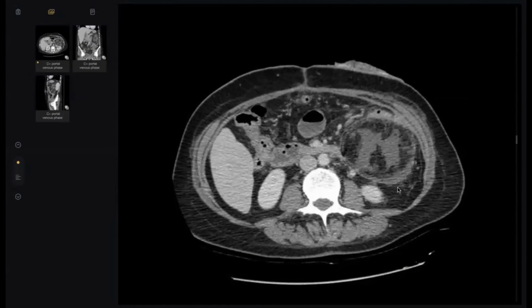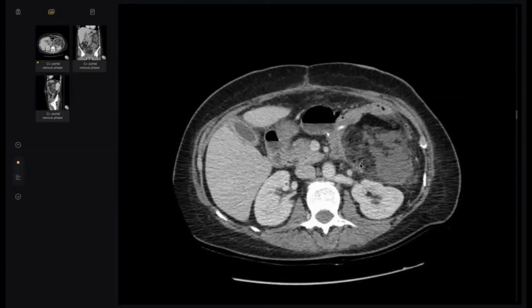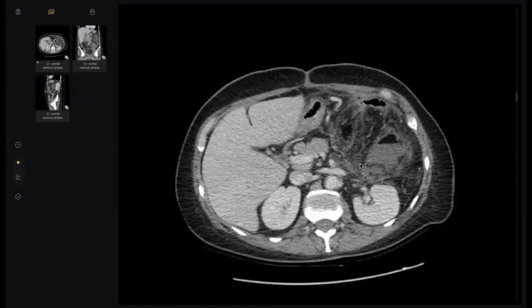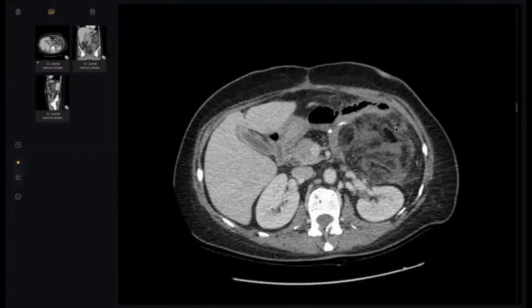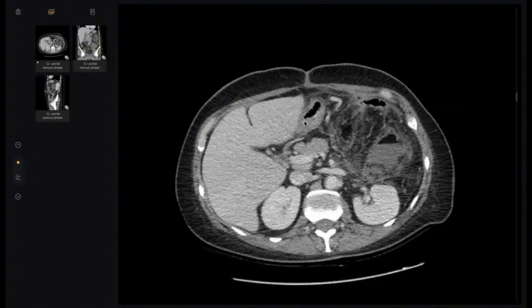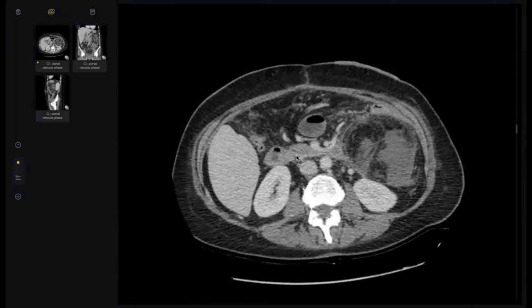But here we find abnormal fat, and the patient is post-operative, so we must put number one, omental infarction, in the first differential diagnosis. Number two, leakage. Why? Because there are anastomoses here, a loop and a loop. Look here, this is the stomach. Follow the stomach and go down. This is the duodenum.